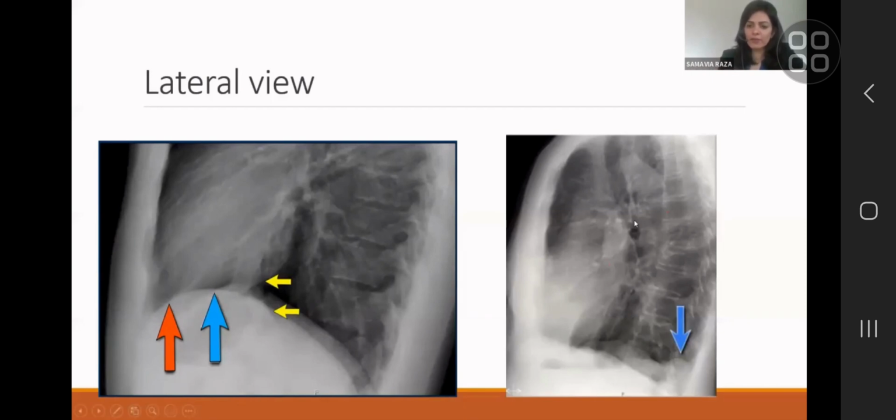If you see lymphadenopathy on a lateral view, I don't think I've put in a film, you will see it as bang on little balls, because on the frontal view, they are covered with the heart and the other mediastinal outline. So you kind of have to make them out. On the lateral view, you are seeing them end face, so they're much more clear. And it's very easy to differentiate them from vessels on a lateral view compared to a frontal view. There are no other accurate landmarks that I can think of that are relevant to you at this stage for the lateral view.